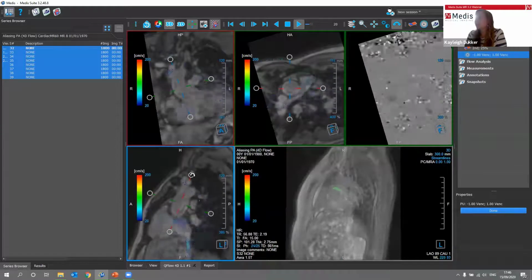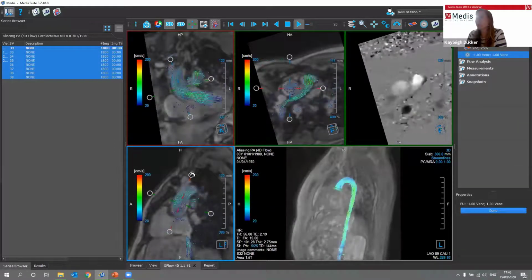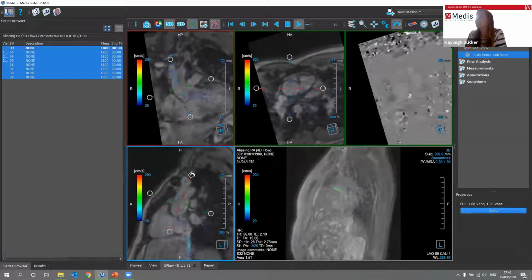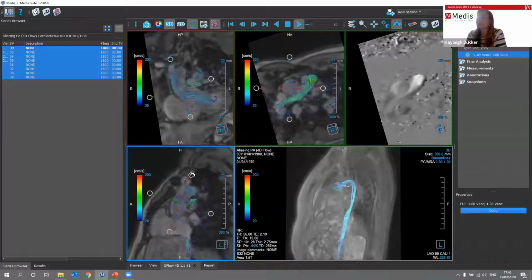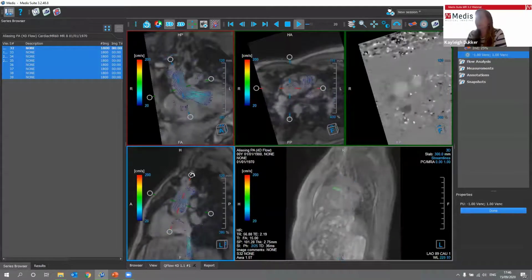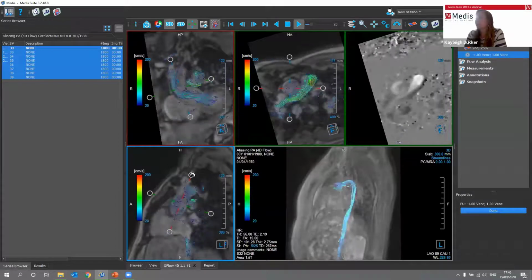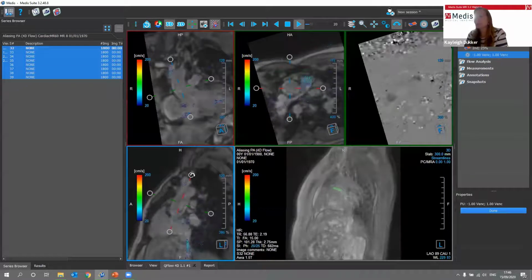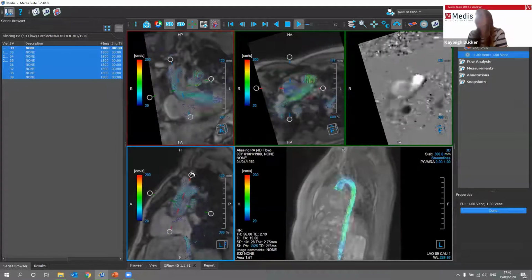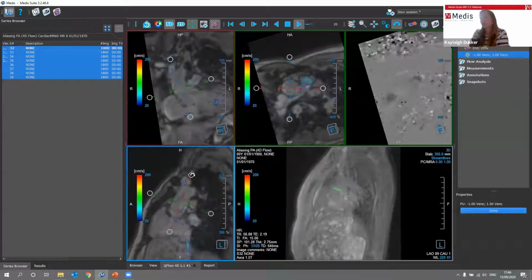There is a difference in measurement power, basically, or measurement time that is needed to do either first, second, or third degree background correction. The preferred way is a bit depending on whether you have a 4D flow or a 2D flow. So if you have a 2D flow case, then first degree would be good enough because you only have one plane.